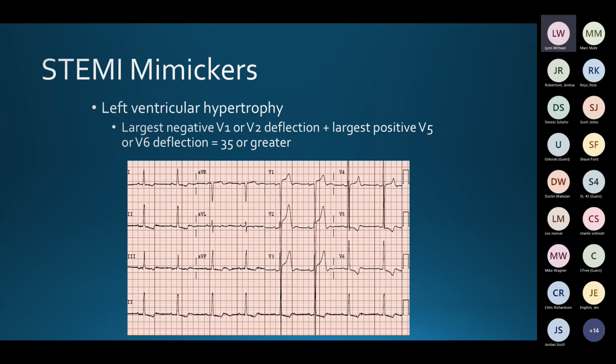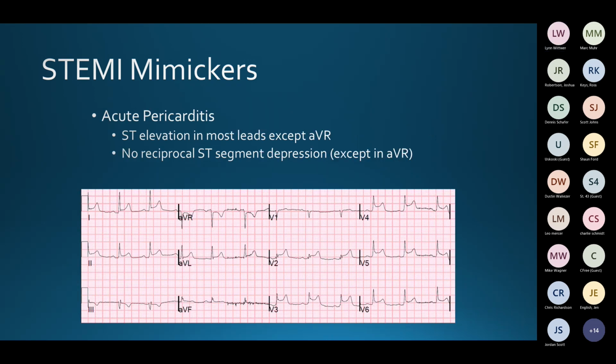You just look at this one and you know it's ventricular hypertrophy, and then look at the QRS that's associated with it, and the ST segment is markedly elevated, at least in the anterior leads, but that is easily confused then for being a STEMI.